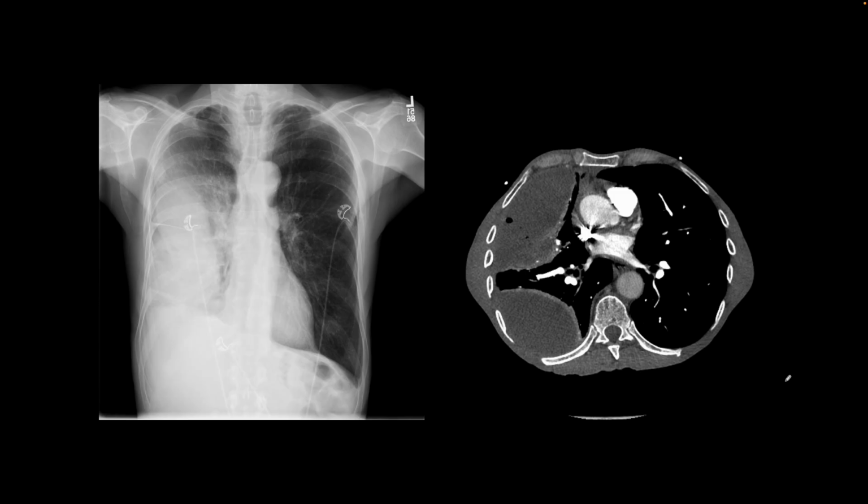This is our next patient, and this is a good example of how correlation of chest x-ray findings with the CT helps us understand the pathology better and become a better reader of chest x-ray. So let's start with the chest x-ray first. There is an ill-defined opacity that involves the right hemithorax, the mid to lower lung zones. The costophrenic angle is not clearly visualized. There is some obliteration of the right hemidiaphragm. The left side looks clear.